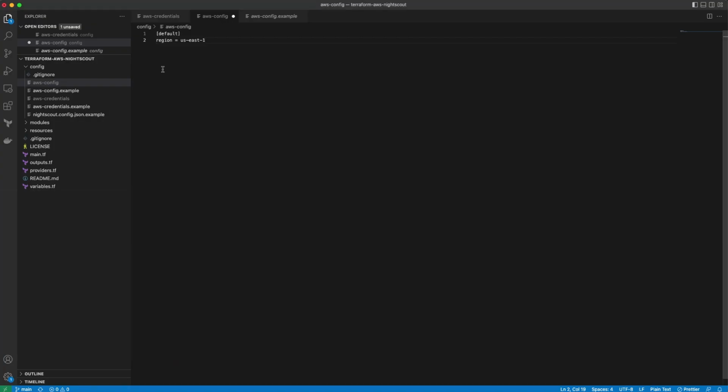So if I head back here, I've left the default as US East 1, which is that North Virginia one. That'll work for pretty much anyone in North America, Canada, that'll be fine. But if you're in Europe or Australia, it's probably something that you want to change. So for me, AP Southeast-2.